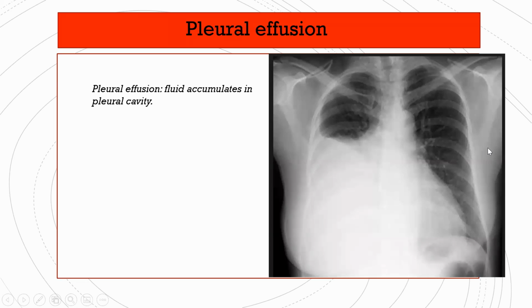And just to draw your attention, these little shadows here, you can say if you know in the chat, but what do they mean? They're actually the breasts of the patient. You can actually see the breast on the chest X-ray in some cases, not all the time, but in most cases you can see it. So you can tell this is a lady patient.